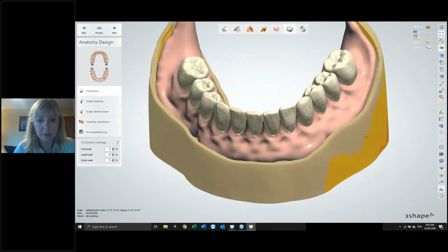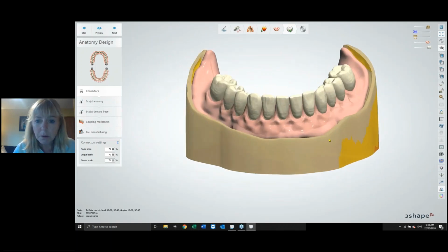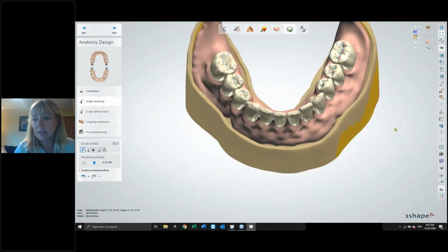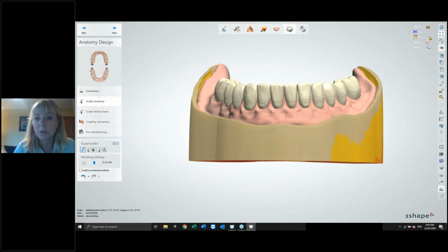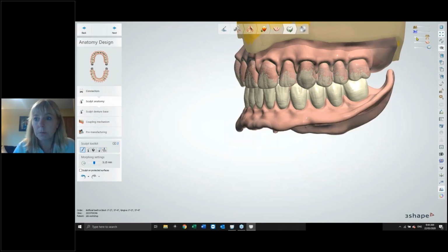This is the 3Shape Intense, which I probably wouldn't quite pick for this one, but this is your connectors, which we're just going to flick through because we've already got our connectors. We know what size we want. And Sculpt anatomy, yet again, you can put it on your articulator. And also, around this stage, sorry, I'm going to put that one on that one.